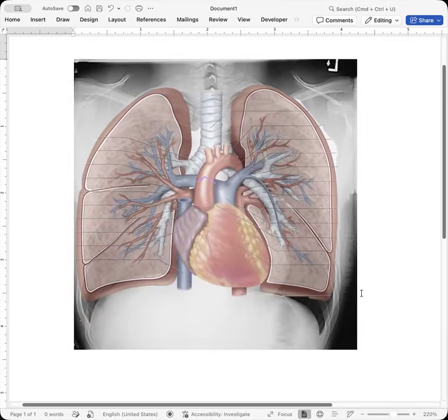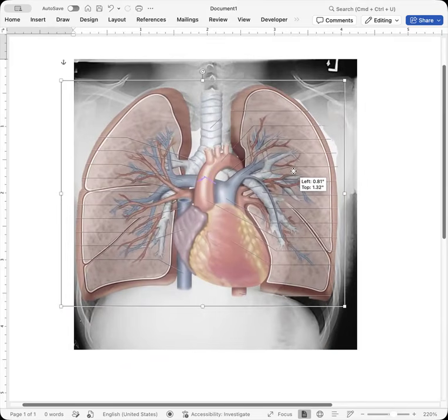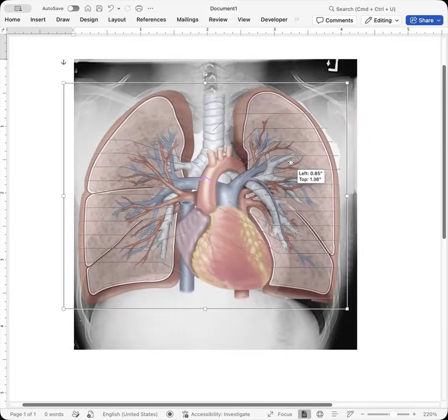Okay, so let's quickly recap what's going on with chest X-ray anatomy. I've overlaid this lung field combined with the trachea, bronchi, the heart, aortic arch, and so on. And I've kind of overlaid it on a chest X-ray to help us out here.